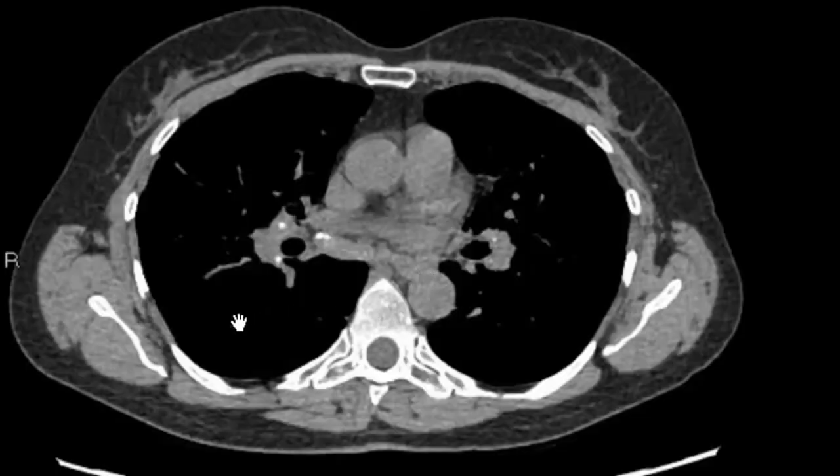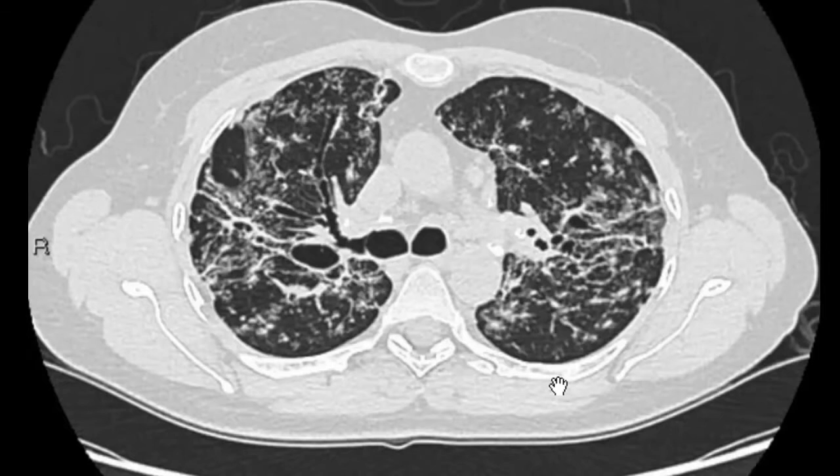An axial CT scan image from the same patient, a bit below the carina, and you can see calcified lymph nodes. You can see calcification here, and you can see calcification here. These are enlarged calcified lymph nodes. An HRCT image from the same patient, a cut taken just below the level of the carina.